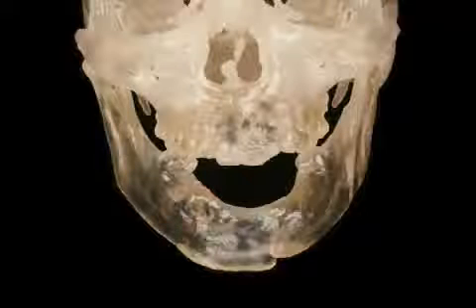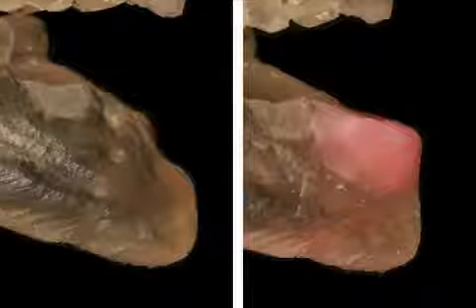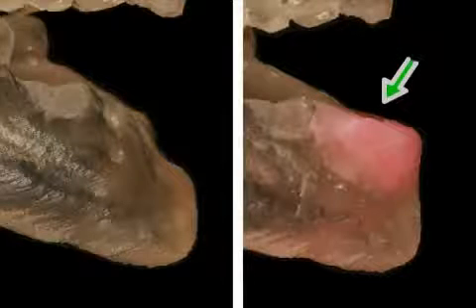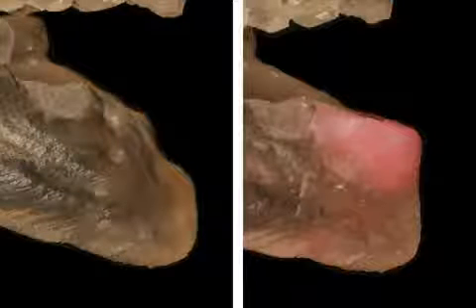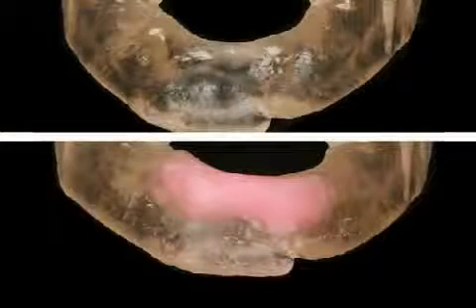This patient was involved in a traffic accident and lost not just her teeth, but parts of her jaw as well. On the left, you can clearly recognize the missing bone. On the right, you can see that the missing part was replaced with a pink compound. Here is the front view once more.